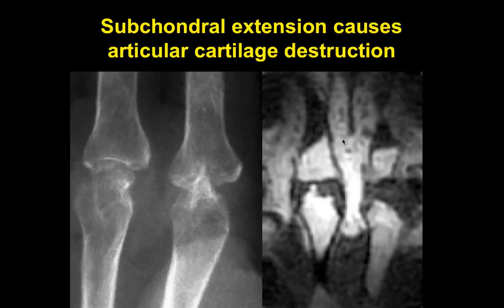Here's another example. Here we can see pencil and cup deformity, an old classic X-ray finding, and you can see the erosion probably started here from the mechanism we talked about. It's eroded the subchondral bone here, and now we just have a little tiny spicular bone, so all the force through this joint is going through this little tiny area, so the pressure is enormous at that point, and you destroy the bone. So again, we believe it's very important to detect these early and treat to stop this process before you end up destroying the subchondral bone and the articular cartilage.